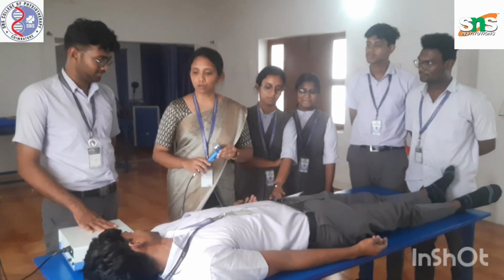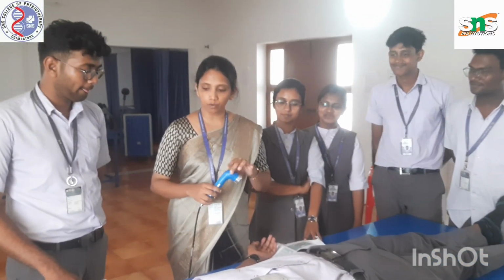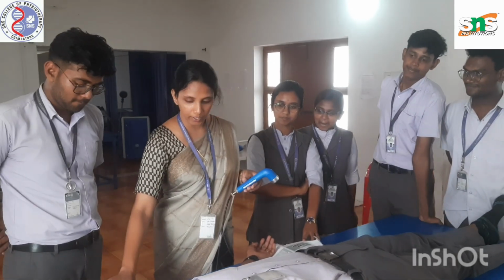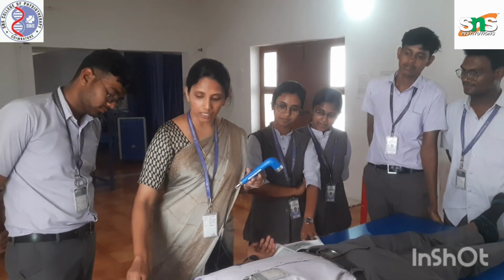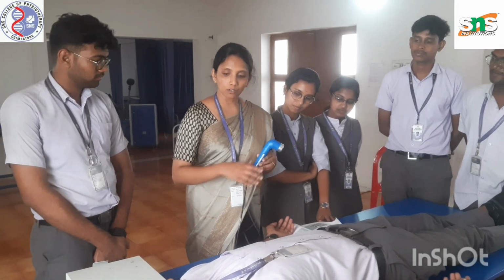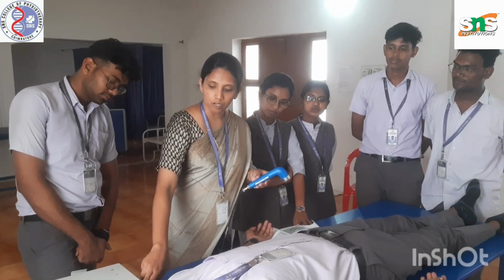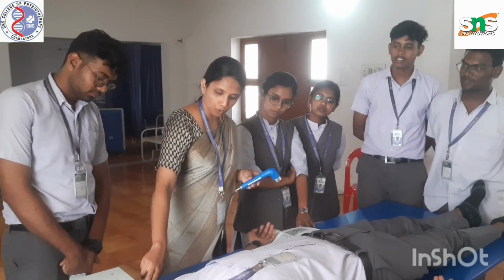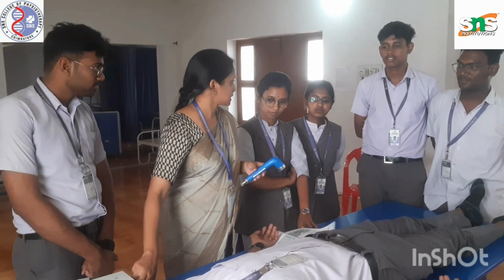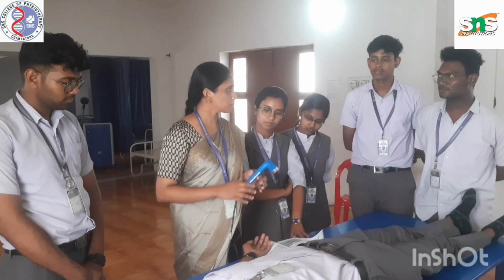So we are going to talk about the ultrasound application. In ultrasound we have an ultrasound unit. In that there are two setups: one for frequency, the other one for the intensity. For the pulsed mode, you can use ratios varying from 1:1, 1:2, 1:4, 1:8, 1:16. These types of application you can use for the pulsed mode.